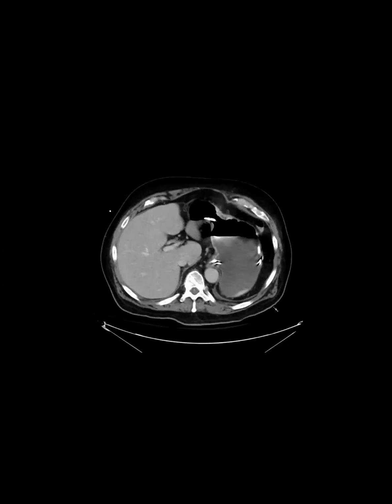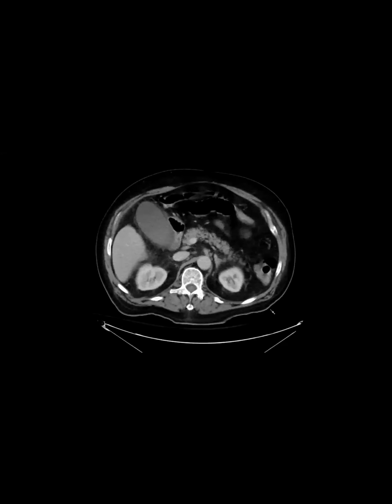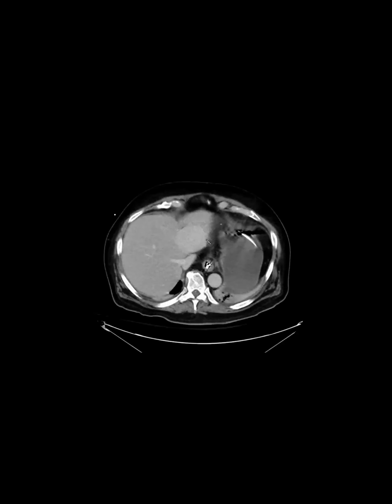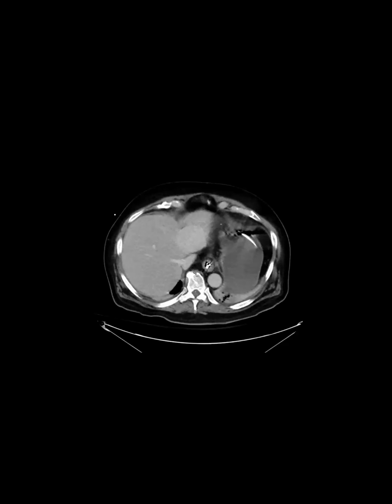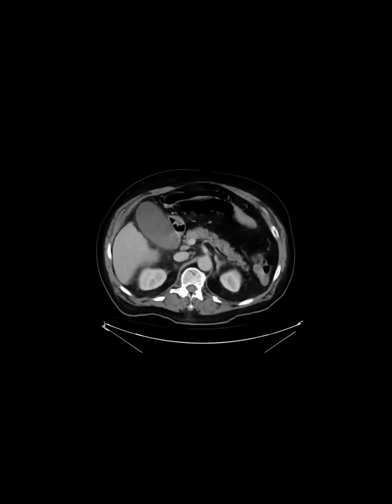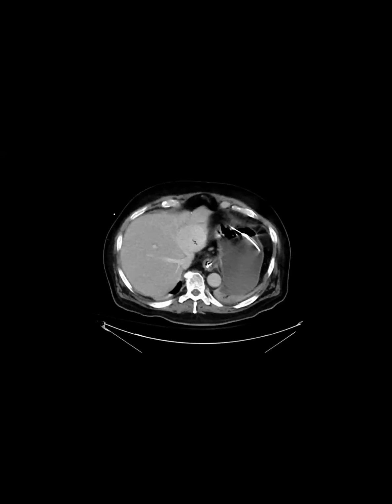Okay, so this is a patient who was having some nausea, vomiting, and some other issues, but incidentally, we saw this lesion in the liver. It's a big lesion in a middle-aged patient. Scroll through some more. Okay, so with the incidental liver mass, we recommended an MRI.